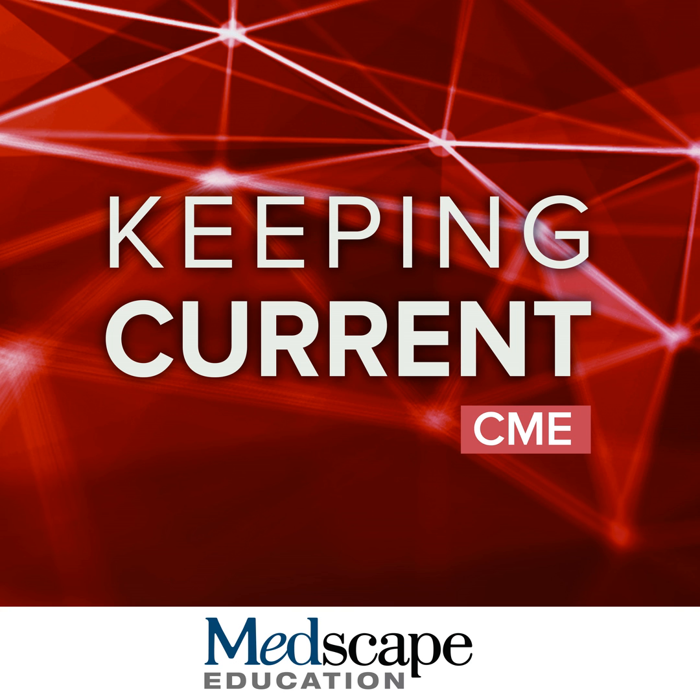Here's an example where we have some scar. So for example, you can see on the bottom here with the magnitude image, you can see the scar here where you have an optimal TI, but when you have a suboptimal TI with the magnitude image, you cannot see the scar. Whereas with the phase sensitive reconstruction, you always see the scar, even when the TI is too short or even when it is too long. So it works over a wide range of inversion times.